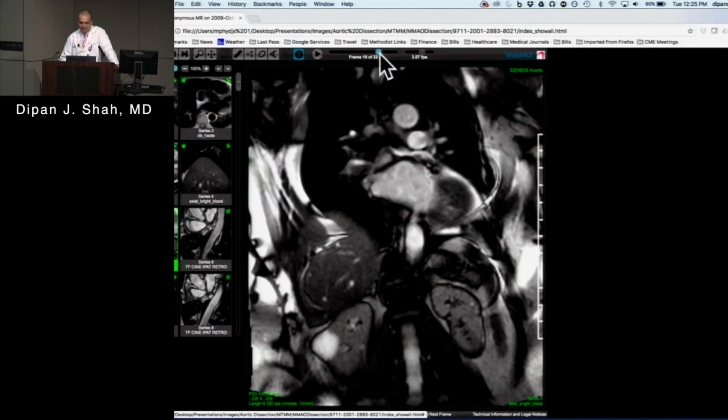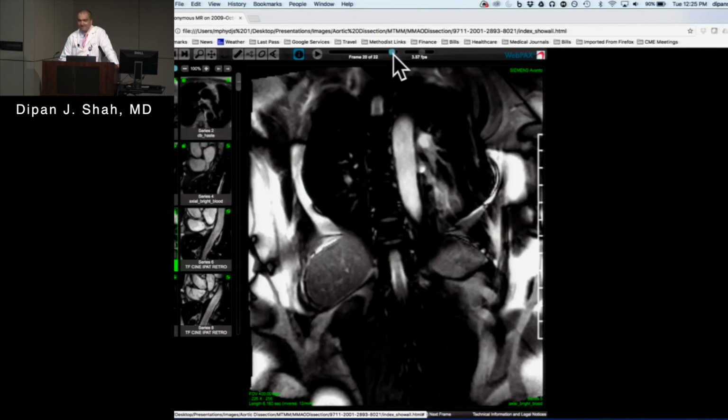And you see it as well, right? So I mean, I think at this point, you've got to say there's no way this can be an artifact when you're seeing it in multiple different orientations. Yeah.